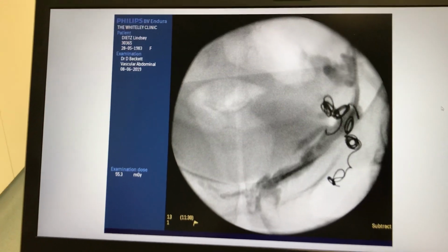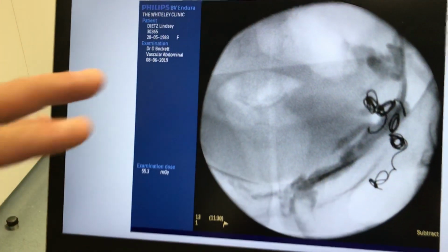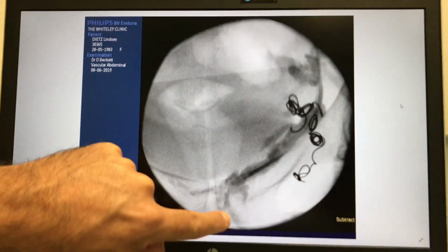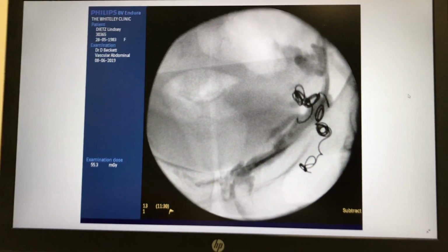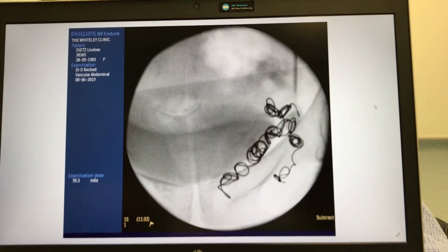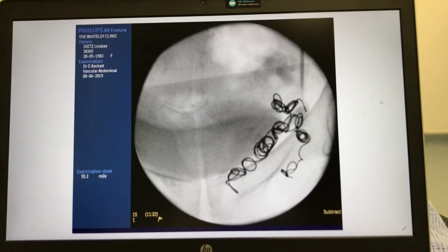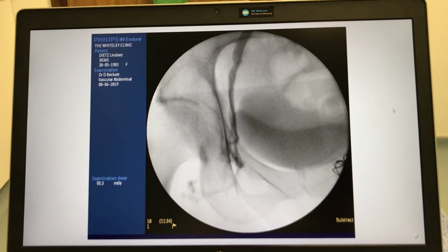So that's how big it is. And it's supposed to be as big as, I mean, the catheter? This vein is bigger than normally in the pelvis. That's probably roughly a normal size vein down here. That's still quite big and chunky, okay? And then another picture with the coils sat in those veins, showing that we've blocked that pudendal vein as well, okay? We then move to the opposite side.